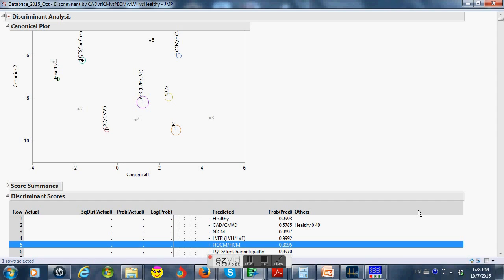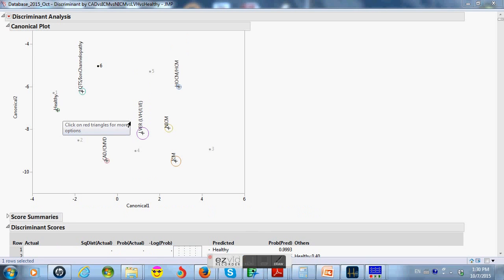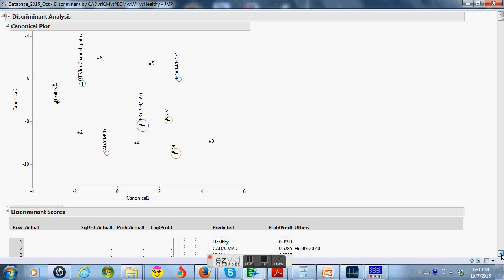And finally, we'll look at our sixth patient, who was the 14-year-old male who had a normal conventional ECG, but positive logistic score for disease, negative logistic score for LVSD, and a long spatial JT peak interval as corrected, a couple other minor 3D ECG abnormalities as well. And so we can see there he is, number 6. He looks like he's orbiting that ion channelopathy or long QT syndrome planet.